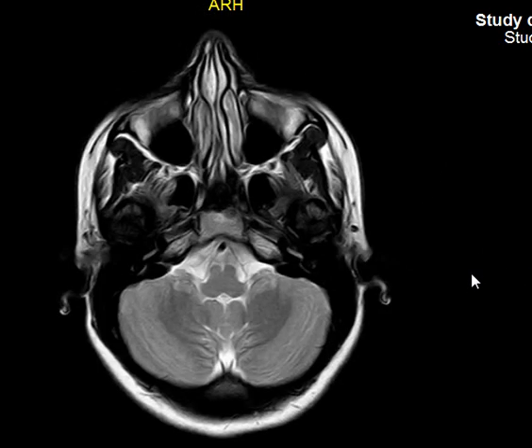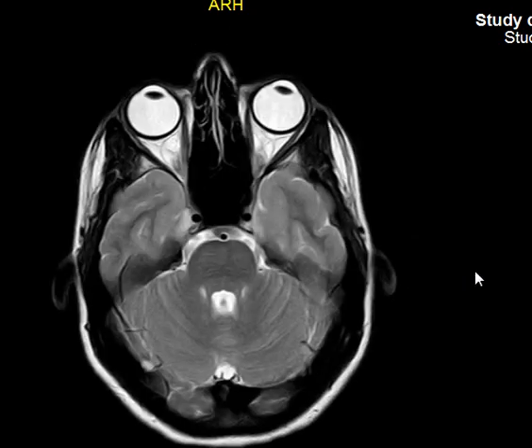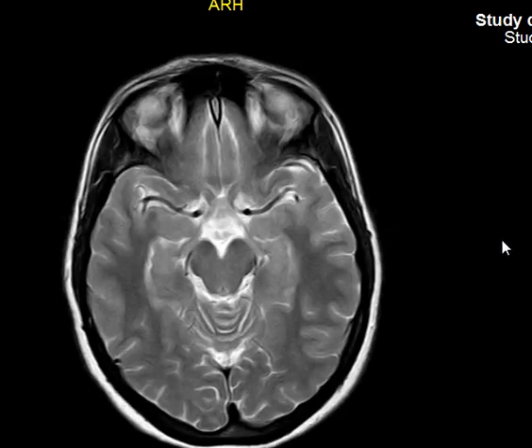This is what we call a T2 weighted image in the MRI. It's what we called what? T2 weighted. Always don't forget the weighted. When you say this is a T2 image, that's scientifically wrong. You need to say T2 weighted. Why? It is something related to physics that will need some time to explain. I don't have the time to do it now, so maybe we'll do it later, but always you say T2 weighted, T1 weighted. You don't say T2 image or T1 image, okay?